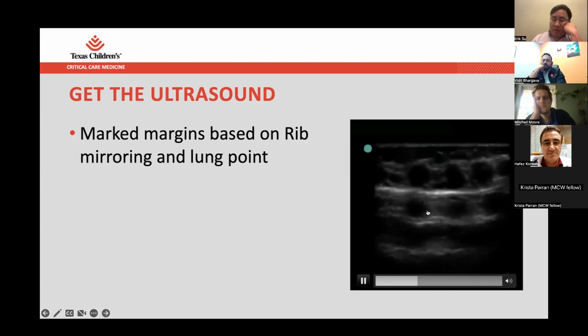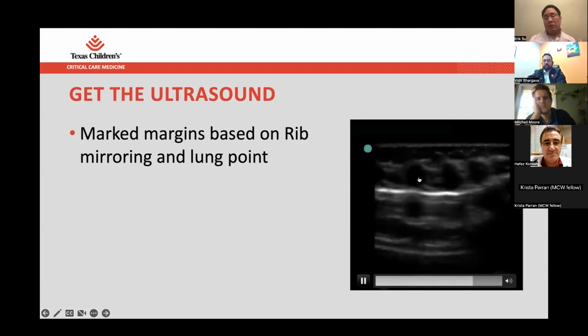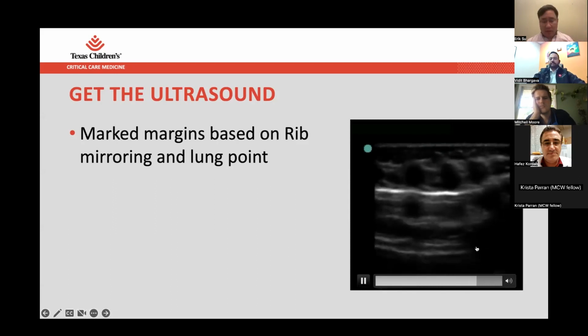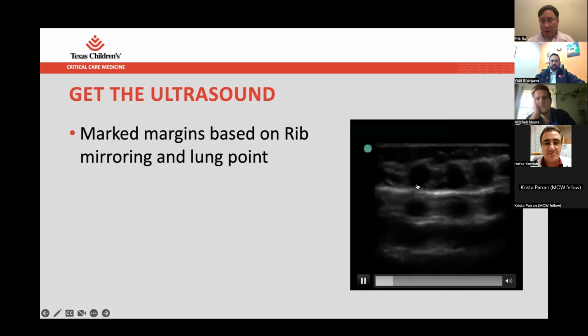And then the machine tries to imagine what is there, but because it's just the tissue that's in here, you see the intercostal space reflected. And so this kid clearly doesn't have two sets of ribs, one inside the other. It's that the rib is reflected across the pleural line, in a baby, when you have really cartilaginous ribs and you can see through them. And so we actually called this figure 8 sign in something we wrote, where you get all these 8s.